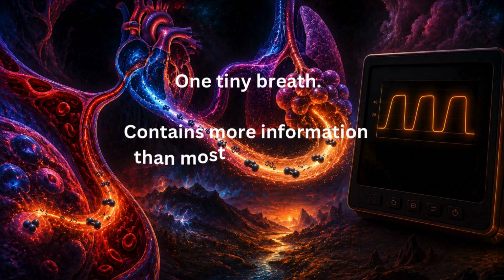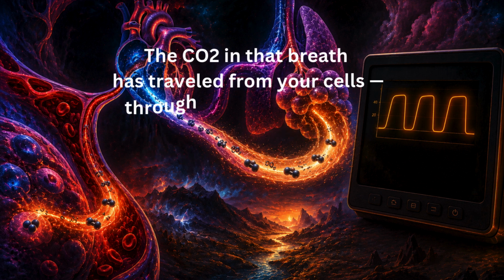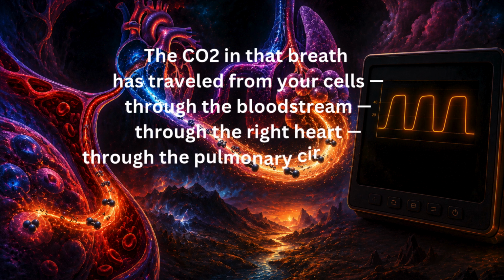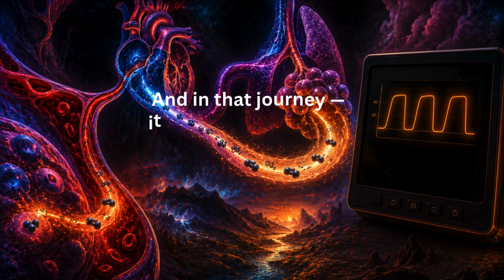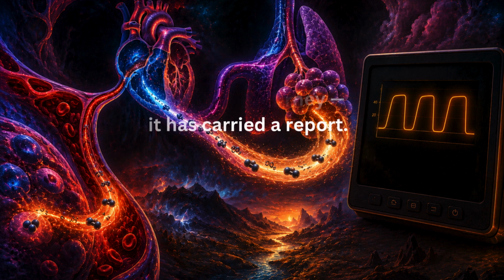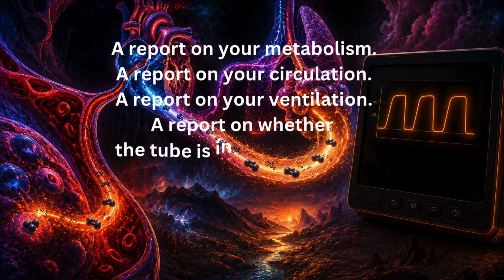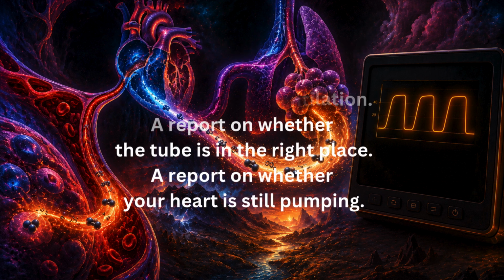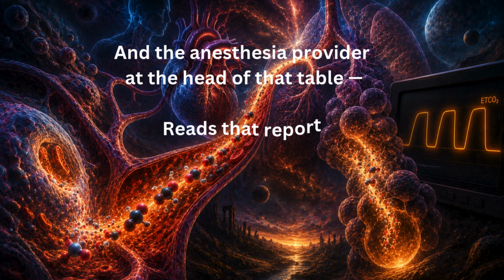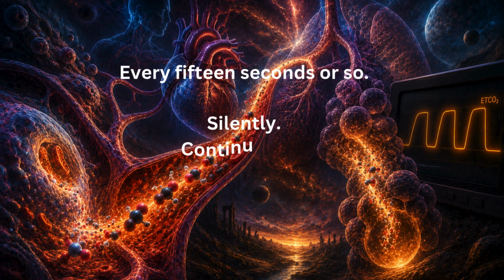One tiny breath contains more information than most people realize. The CO2 in that breath has traveled from your cells, through the bloodstream, through the right heart, through the pulmonary circulation, into the alveoli, past the sensor, and in that journey, it has carried a report. A report on your metabolism, a report on your circulation, a report on your ventilation, a report on whether the tube is in the right place, a report on whether your heart is still pumping. And the anesthesia provider at the head of that table reads that report with every single breath, every 15 seconds or so, silently, continuously, all case long.